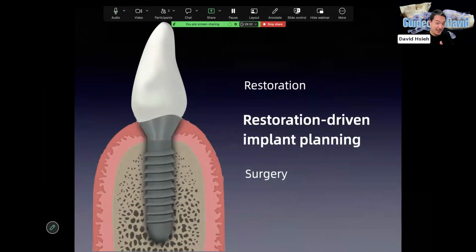There's a very interesting phrase here: some doctors will say, the tissue is the issue, but the bone sets the tone. That makes sense, you have to follow the bone. But I also learned from working with other oral surgeons.